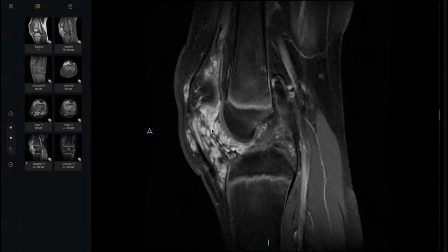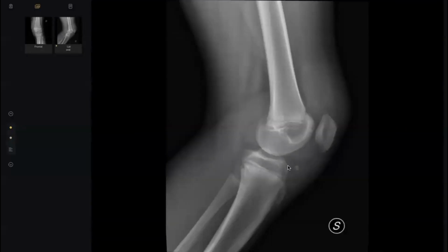What is the name of this pathology? Soft tissue mass. If we do MRI, we must do X-ray to see, especially for this. This is pathognomonic when seen inside this enhancing mass.